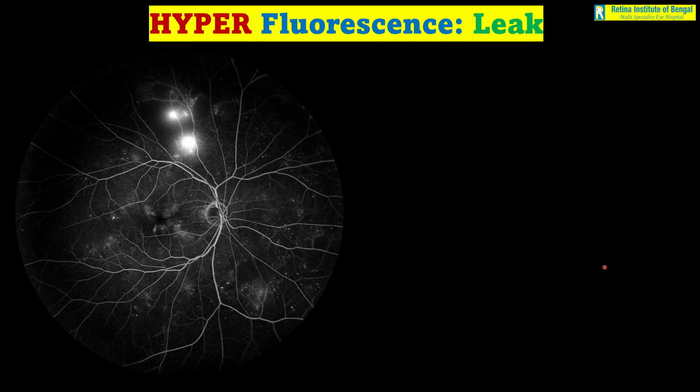Then comes the other pattern, that is hyperfluorescence. For example, in this case, you see these intense white areas, and obviously we don't see anything like that here. So this is somewhat a normal pattern, but this is something unusual, extreme white areas. This is what we call leak, and this leak is because the blood or the dye along with the blood is leaking out of the blood vessels.